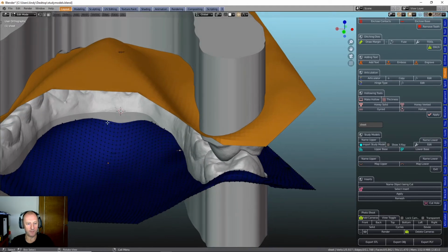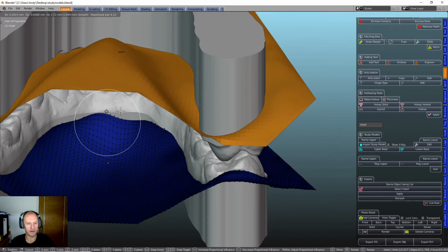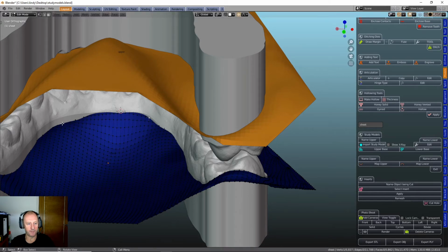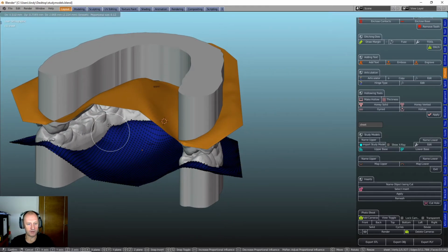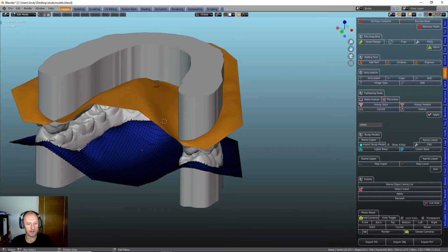Now, my field is not orthodontics, it's crown and bridge. So when I do these study models, this is purely just for clinicians to review cases, and it's not as critical as an orthodontic case, which obviously has to conform to certain standards and dimensions.